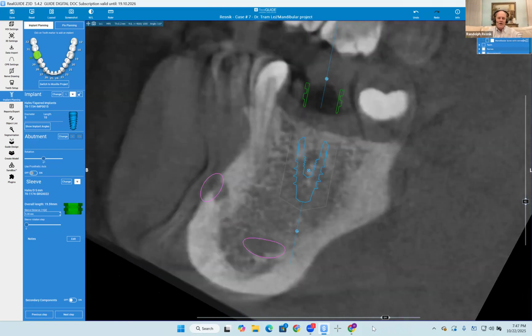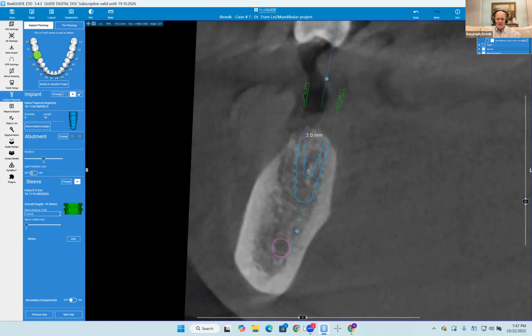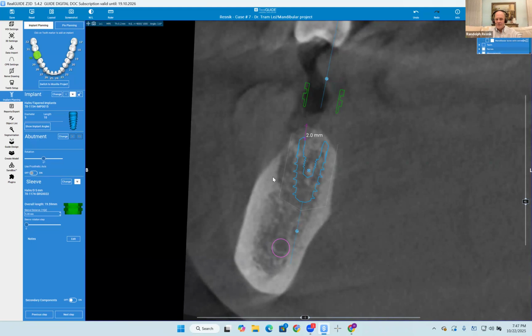So, Doc, on this one, the good news is you have a type 3 nerve. Look how low the nerve is. On the facial there, you have a radiolucency there. Do you know what type of bone he used?